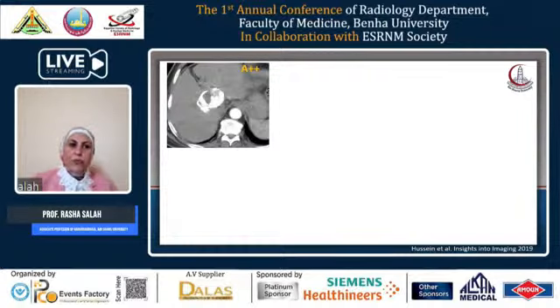The gold standard role of MRI is post-treatment assessment, especially if the patient has undergone chemoembolization, because the dense lipiodol condensation can mask the underlying residual viable tumor. Let's see this patient with the previous chemoembolization. We can see that there is dense chemoembolization located at the periphery of the lesion. However, there is no lipiodol condensation noted at the center of the lesion.